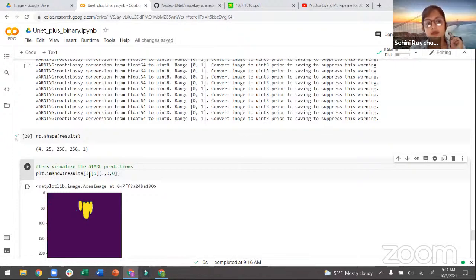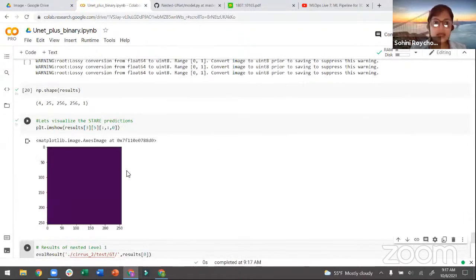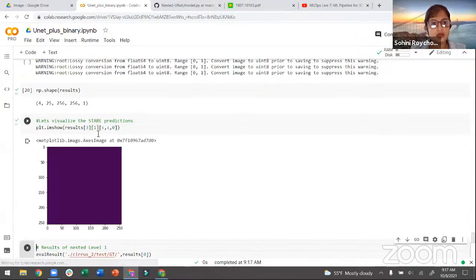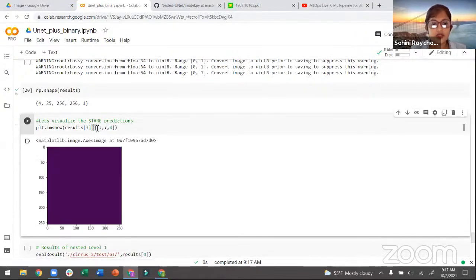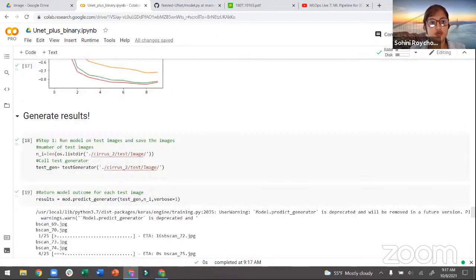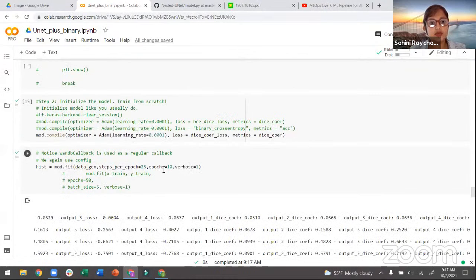So here I'm printing out the result at the final depth, so depth 4, and this is image 5, right? And this is just the 0th plane. So at the final depth, sorry, this would probably be an odd image. Let me try out. Okay, I think this has not converged. That's the reason why. Yeah, this image is not converged. So what I'll really have to do is allow it more epochs. This is a good learning experience, right? Just doing 10 epochs doesn't really converge, so you'll have to run it for at least 40.